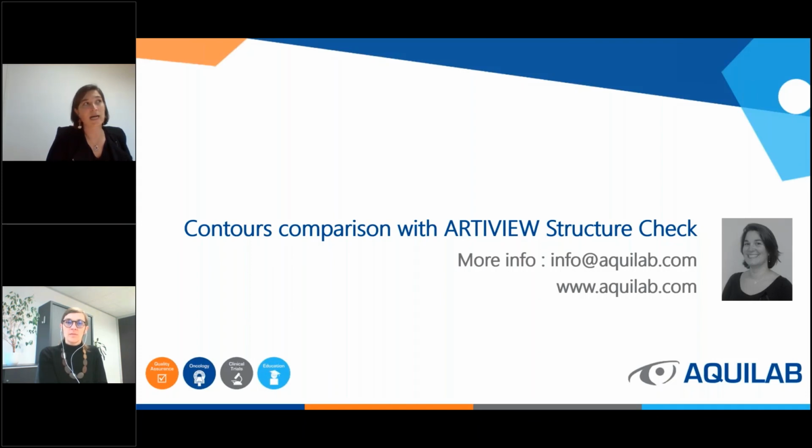We will also have the STAPLE extraction contour available. And of course, we are always open to discussion about new indexes which should be added to a further version of the software.